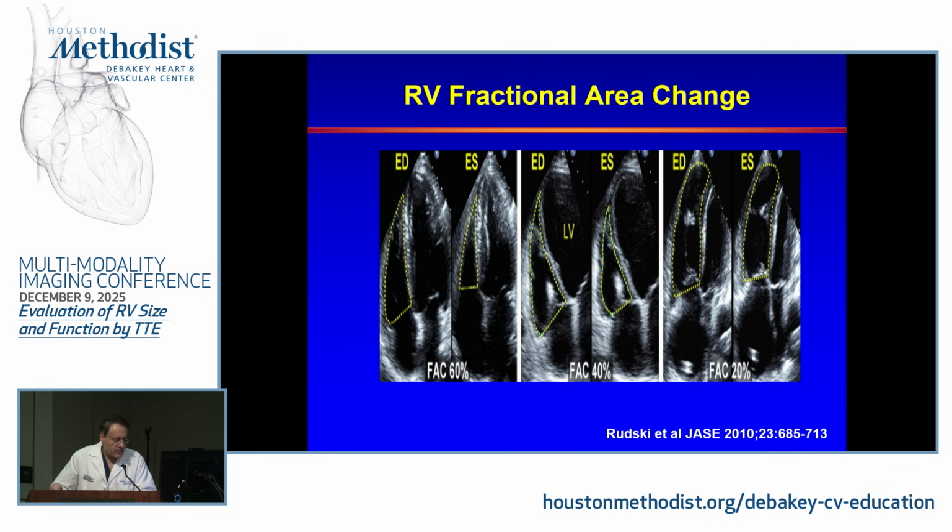As the ventricular function gets worse, as you expect, the ventricle dilates, and so the area increases, and the fractional area change drops. If I don't see the endocardium well, of course, my measurements will be wrong. So I do not do this measurement just for the sake of doing it. I have to see it, and ideally we see it from the RV focused view.